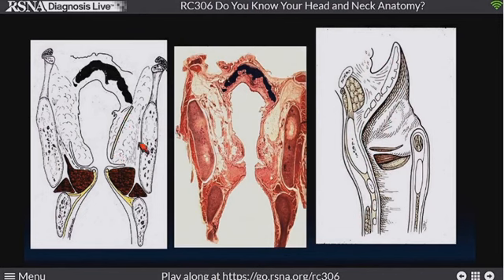This is the true paraglottic space. It's bounded by the conus elasticus and the quadrangular membrane. It's good to know that they are there, but it really does not figure into our diagnosis, these membranes, but they do limit tumor spread. But notice this, that you have fat above the ventricle and muscle below, so that's going to help us find this particular structure.